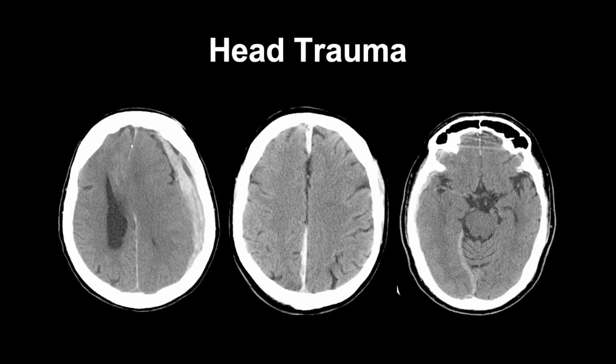And so, as we just mentioned, typically a subdural hematoma has a venous origin. Initially, because it's venous, one might think that the prognosis is going to be better than the epidural hematoma, but actually it's exactly the opposite. And the reason is, as I mentioned, typically subdural hematomas tend to happen in older patients with an abnormal underlying brain, and those patients are going to fare less well when they have a trauma. And so that's why typically subdural hematomas are actually associated with a worse outcome compared to the patients with an epidural hematoma.